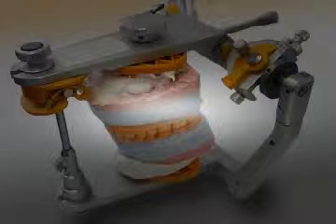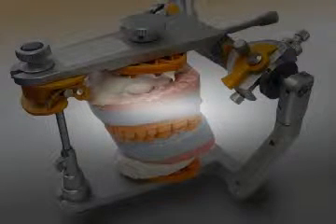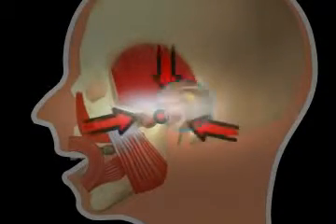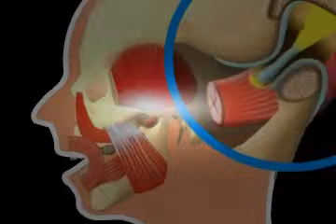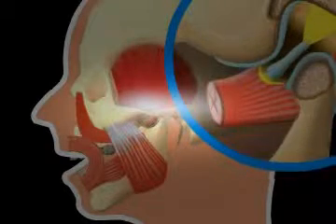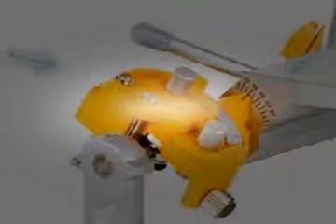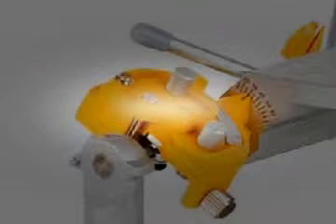Articulators are tools used to create simulations of jaw movements. There is a long history of attempts to simulate the complex movements of the jaw joints, but even today's machineries achieve only partial success. It is of the utmost importance that the articulator is correctly programmed. You can see the various settings on the hinges.